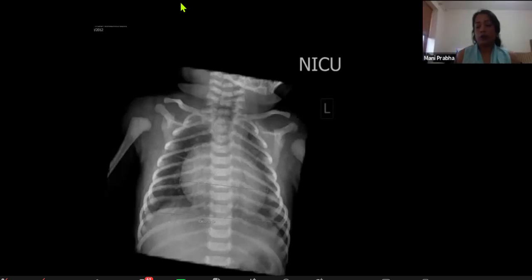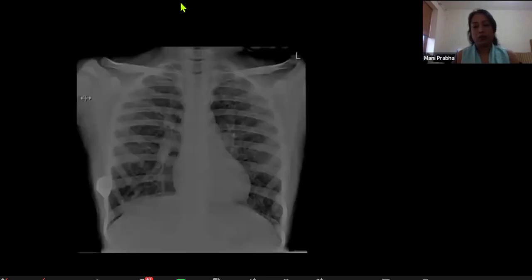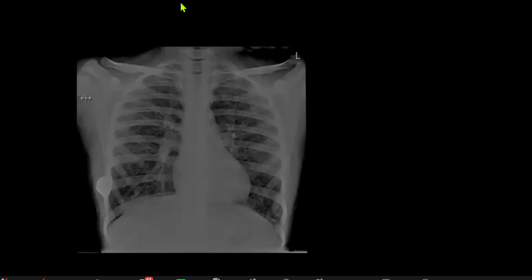Okay. Yeah, we'll discuss it. And the last one, probably, out of the list before we go through all the cases. Yes. So I've got a frontal chest radiograph in an older child. I can see there is a portocath projected over the right hemithorax, and the heart size is normal. There are increased markings around the airways, with ring-like shadowing extending all the way to the periphery. So with the portocath and the bronchiectasis, I'm thinking this patient has underlying cystic fibrosis.